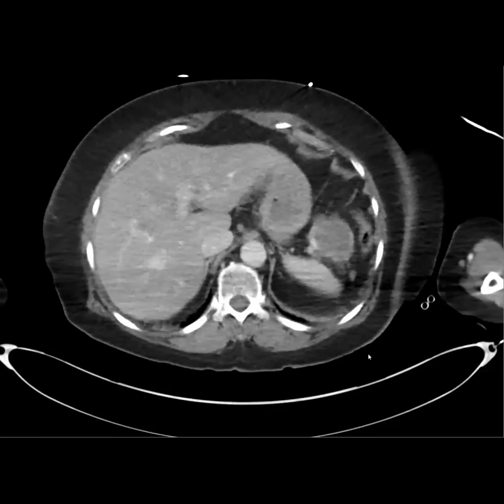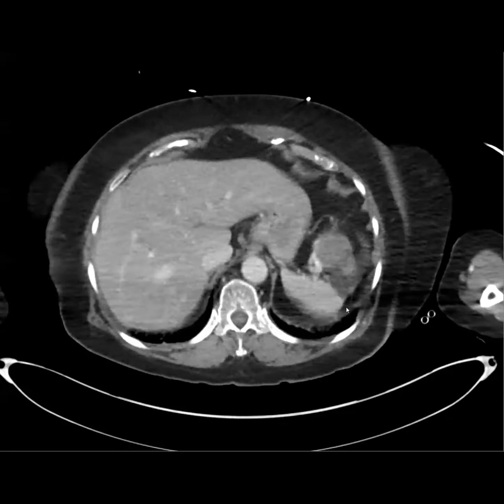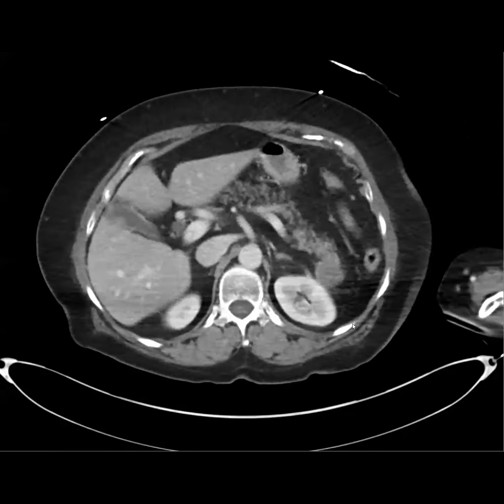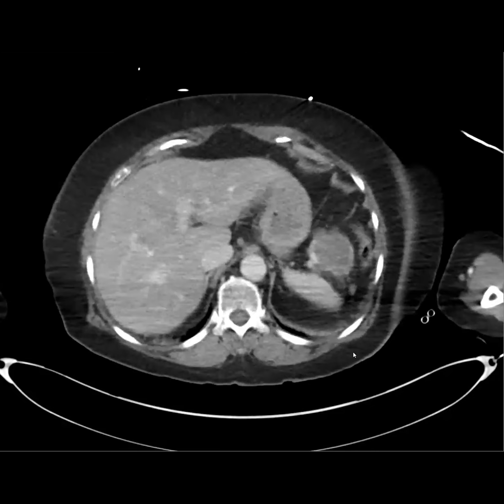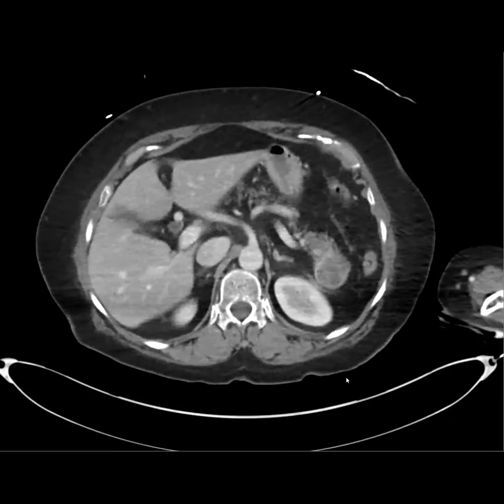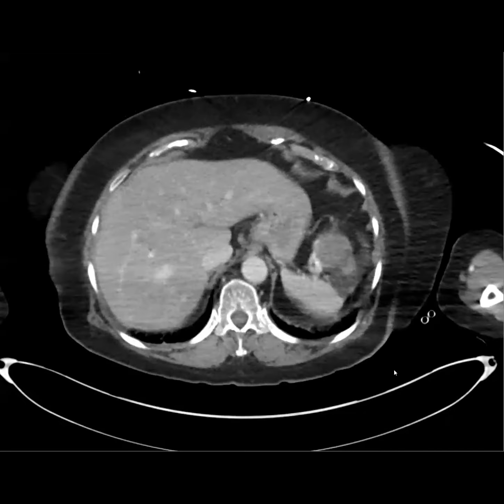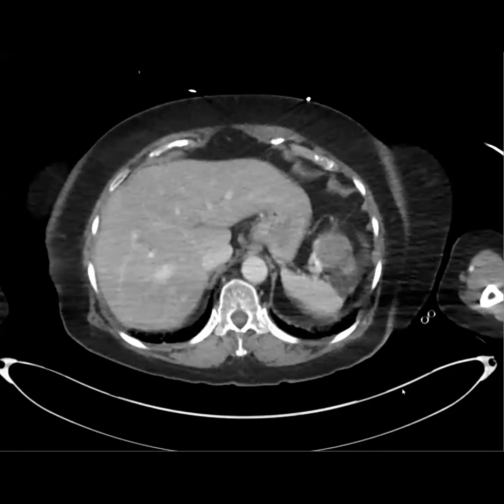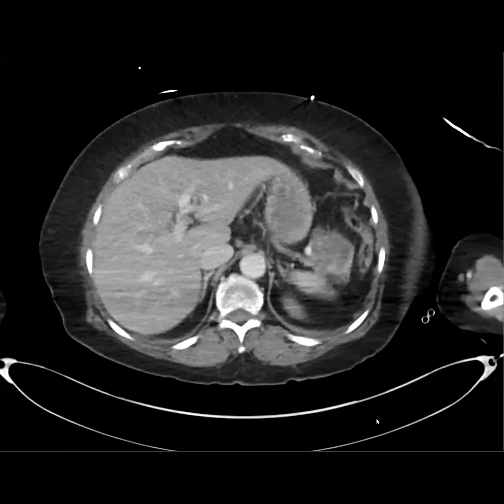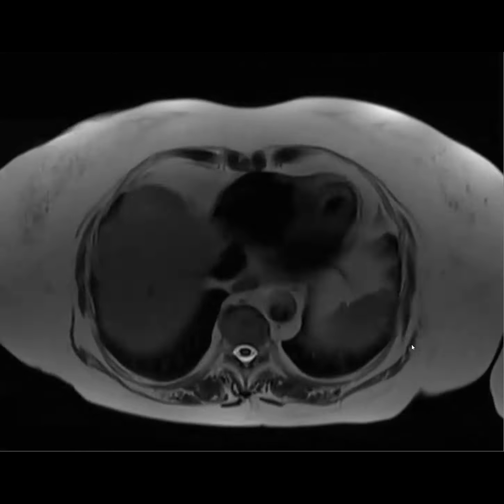One of the questions here is, whenever we see a mass like this, like necrotic adeno or acinar cell, do you recommend an MR for all of these? In a nationalized country, they would probably go straight to EUS. I think MRI can add some value, although I don't know that it warrants the cost. So they went to EUS. I'm not going to tell you the results yet. Then they got an MRI, and this is what it looked like.